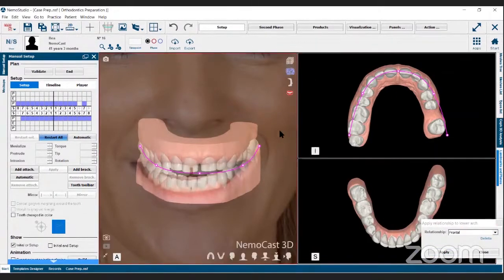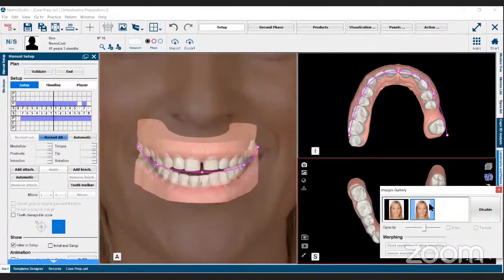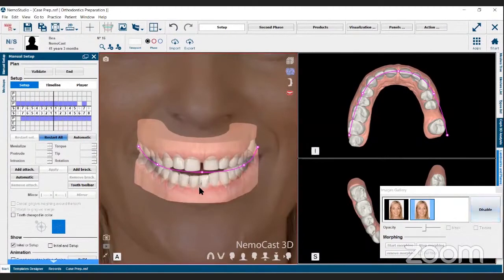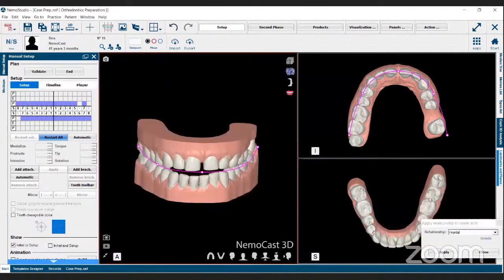And with the photos, let's see if we have the mask here with our photo. Now I believe I mixed it up. So I'm going to create the mask once again so that we can start doing this. I don't think it's, let me bring in a third photo one last time. Sorry about that.